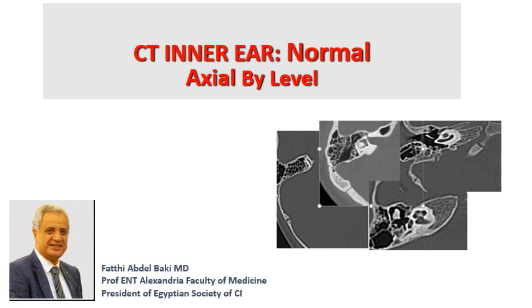Hi, my name is Fatthi Abdelbaki from Alexandria, Egypt, and I'm going to present on the CT images of the inner ear, the normal findings. I'm going to present it in the axial view, going by level from superior to inferior.